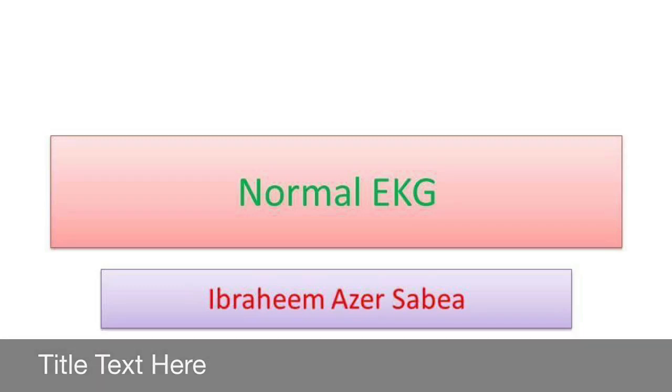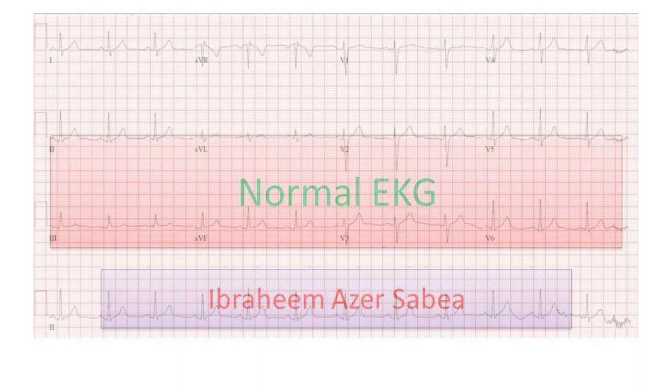So in this series we will talk about the EKG. In this very first video I will discuss some basic principles that you need to grasp before you start your journey with the EKG. I will discuss the normal EKG paper and I will give you some definitions about the waves, segments and intervals that you are going to see on a normal EKG paper.